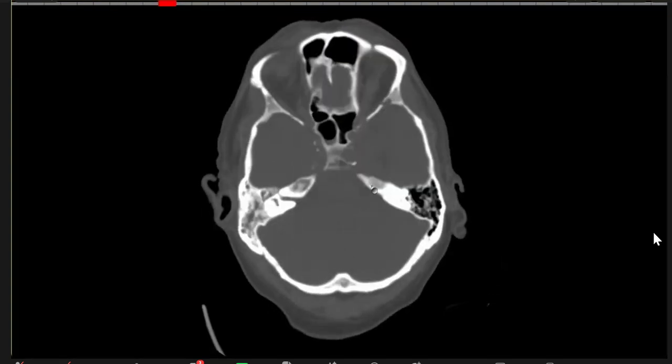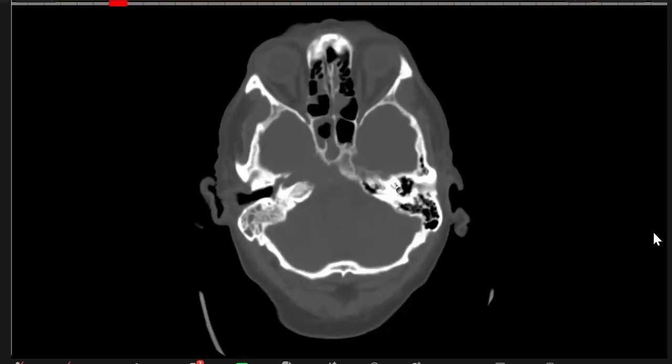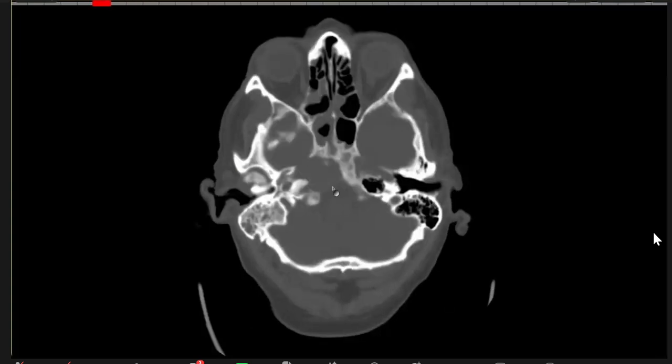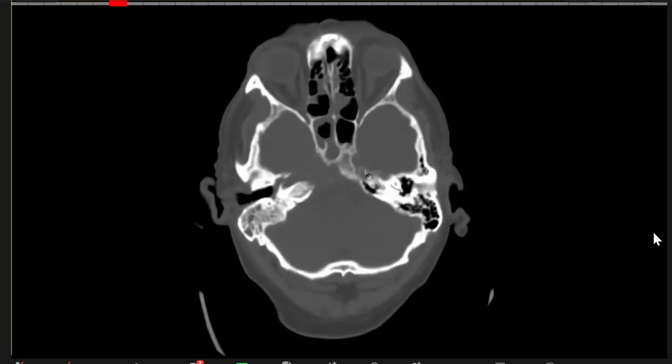So we are coming here. This is the petrous apex. And please remember that at times in the petrous apex there will be aeration, which can happen as we are going slightly inferiorly. You can already see that this petrous apex is there. This is the carotid canal, and there is a large lesion sitting here. Please remember, it arises from the synchondrosis, the joint between the two.